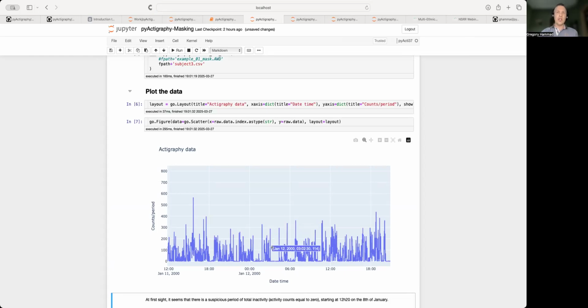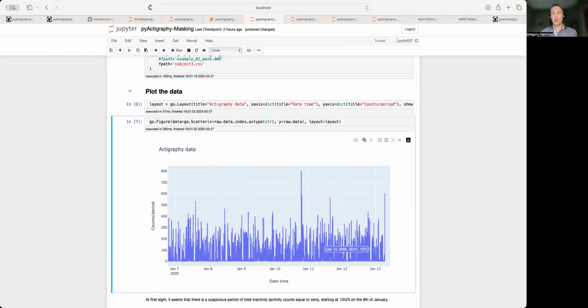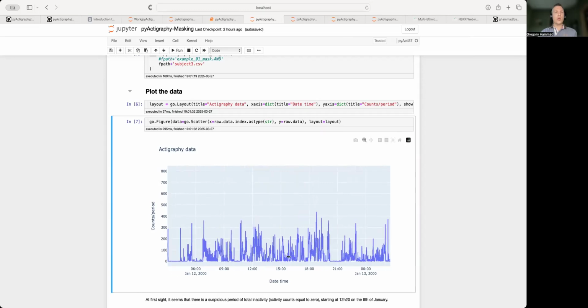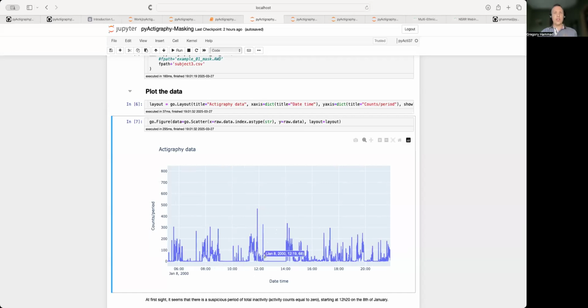So imagine that you consider that this part, oops, not this one. Let's look at maybe this one. Is it the 12? Let's go to the 8 of, here it is. Yes, imagine this one. Here, there is a sharp transition. You select to activity. There was a sharp decrease. So maybe someone just removed its device and you said, look, I don't want to analyze this. And that's something that I should actually exclude from the analysis.